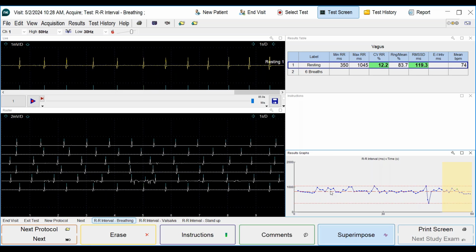Just as we saw in single fiber jitter analysis, we have introduced these levels. So this can be used to get rid of any ectopic beats. You can raise it high, you can bring it up like this. And notice these two beats have been taken out. So that has been simplified significantly.